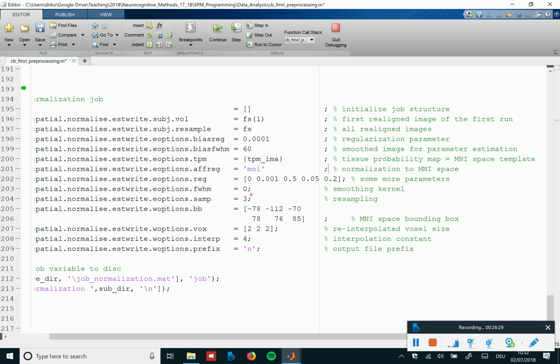Also, what these numbers are, so these here, these are the MNI coordinates. So I guess you've all seen MNI coordinates in papers. They are in millimeters, but of course minus 36, 0 and whatever in MNI coordinates means something in the MNI template space.